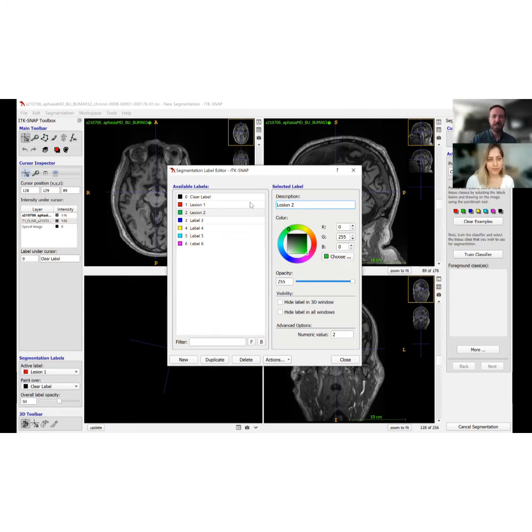Yes, exactly. And then do a label for gray matter, white matter, and CSF. And then you can get even more detailed if you want and add a label for bone, for the skull. You can get as specific as you want, but it just gets to be a lot more work up front. So I'm going to leave it at that.